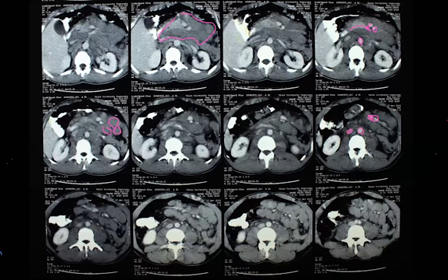So this is the duodenum, the third part of the duodenum. We can see how it is already pushed anteriorly by retroperitoneal nodes. You can see that there are nodes between it and the aorta. Do you see the nodes that lie behind it, the gray area? But this is probably a lymphoma.